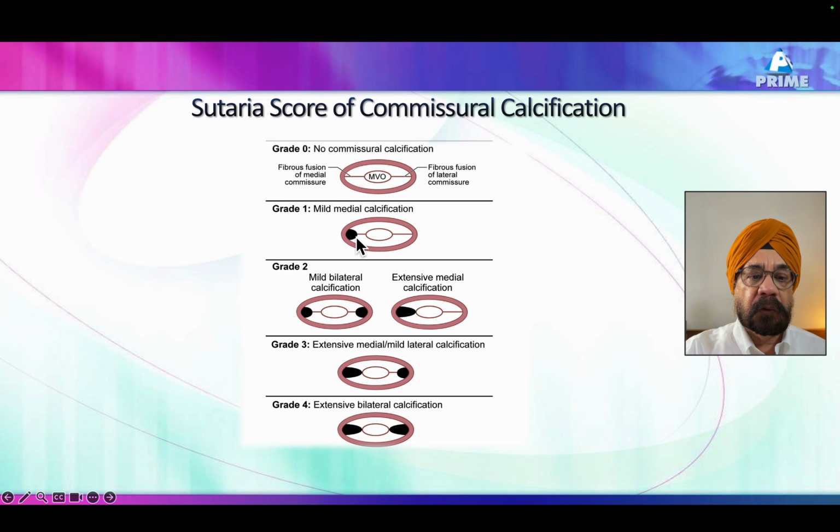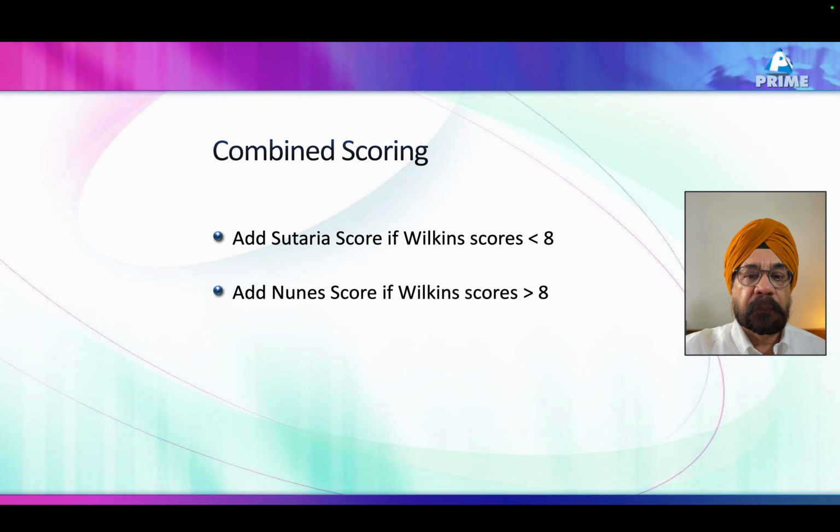It's important to note whether the calcification is just at the tips or it is involving the entire commissure. If there is commissural calcification, the commissures are stiff, and if you do the balloon mitral valvuloplasty, the commissures cannot open because there is calcium there. The tear would happen anywhere else in the mitral valve.